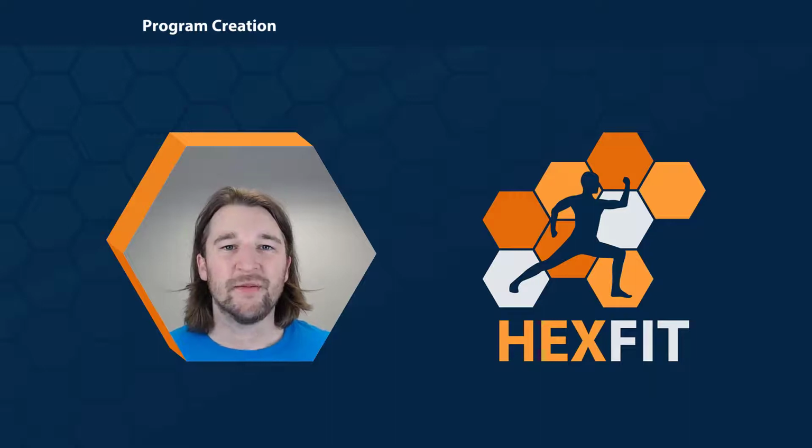Hi everyone and welcome to this video that will show you how to create training and rehab programs in Hexfit.